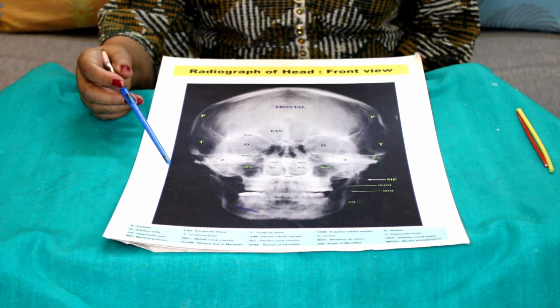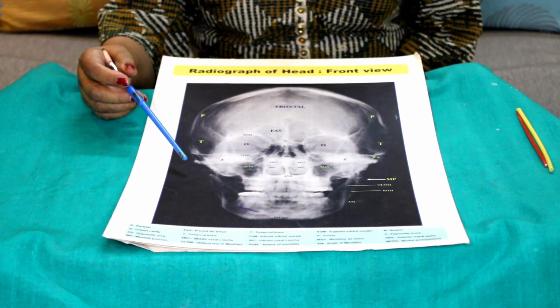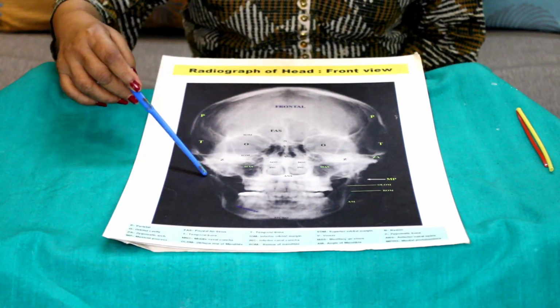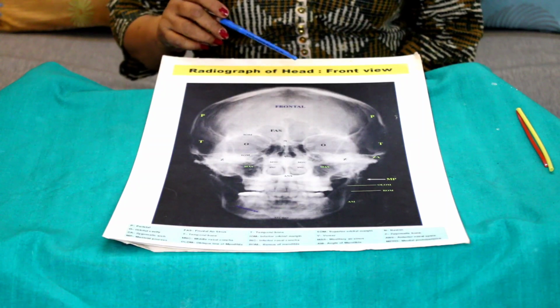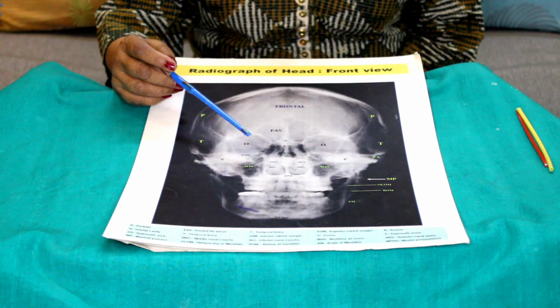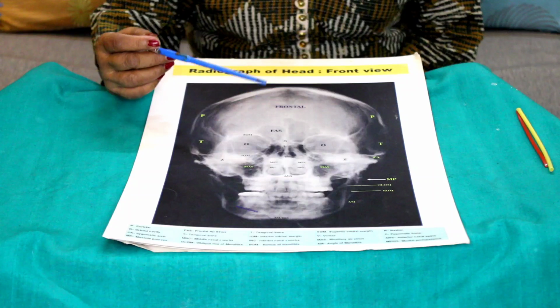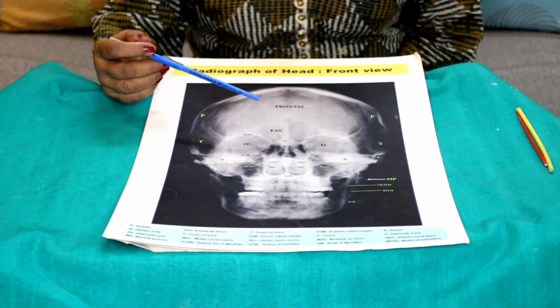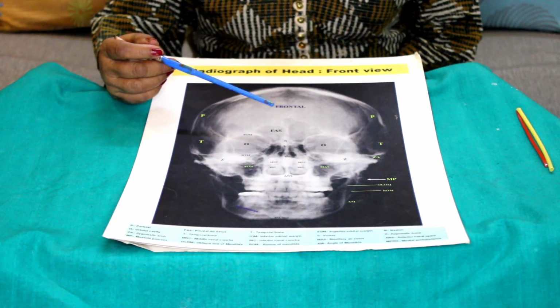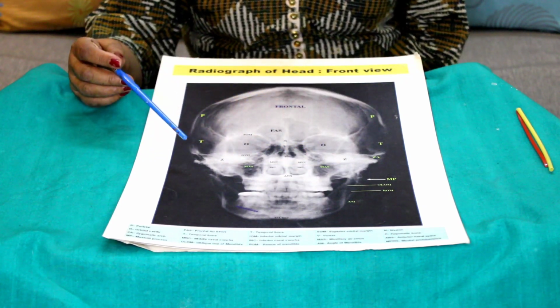Now this is the session of the quick review of the skull X-ray. In this view you will see this is the PA view of the skull. That means rays are passing posterior anteriorly. Why the PA view? If the rays are passing in front of your eyes, it will be very awkward position. So this is the PA view of the skull, and in this PA view the paranasal air sinuses are prominent.